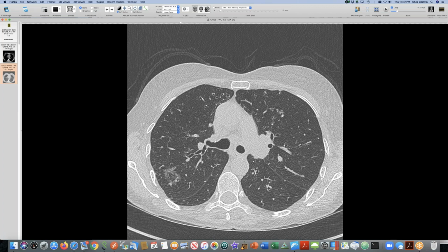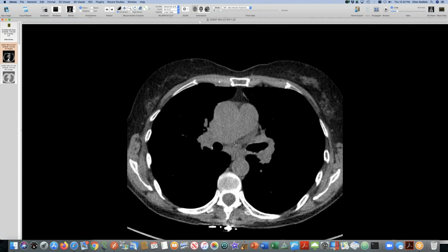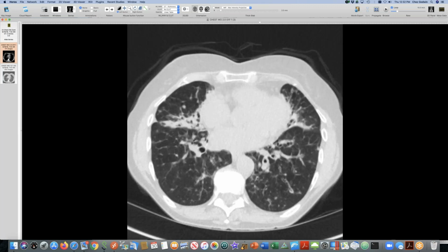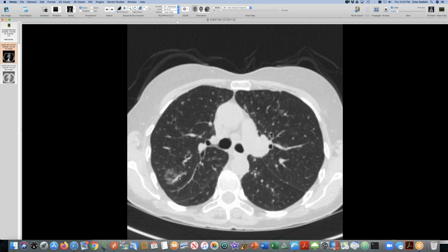The person also has lymphadenopathy that looks like sarcoid. So very nice, clean mediastinal nodes enlarged in mediastinum and hilum. Plus these smudgy things in the lungs. So this got biopsied, and they got granulomas out of this, non-caseating granulomas. So sarcoid-like findings in the setting of this immune deficiency is just fine for GLILD, and so that's the diagnosis they're carrying in this case.